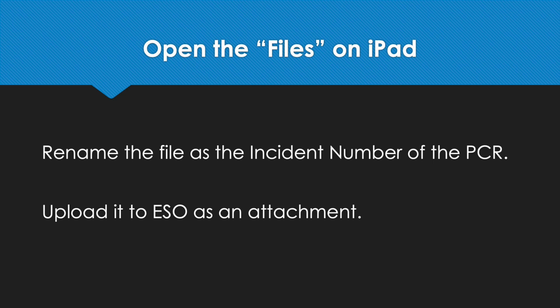Again, once you do this a few times, it's not as step heavy as it seems, but you'll kind of get it just like everything else. Once it's attached, you'll see it there. It'll be a PDF document with the scans on there. If you did a video scan, you can actually click on that video scan and it will show the video.